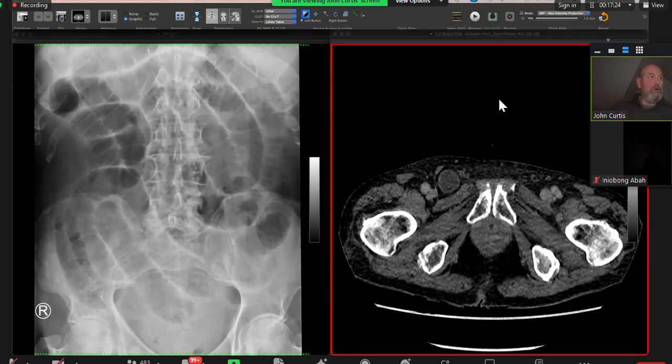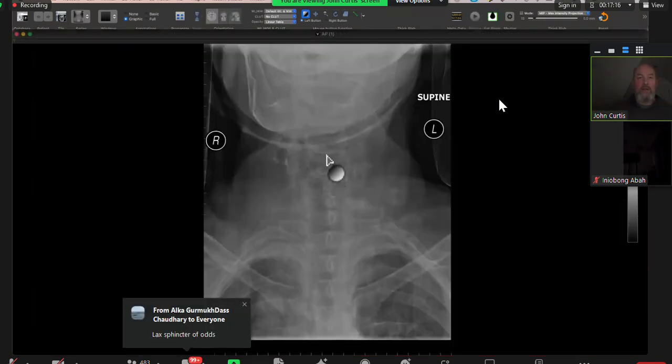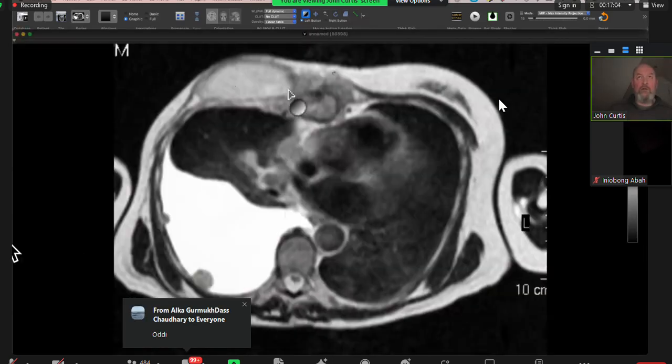This was a cruel one, really, but whenever you look at a cervical spine X-ray, carotid calcification, I was giving you lots and lots of hints that there was no bony injury. Always look at the lungs, and this patient had a bronchial carcinoma. One slice gives the whole story.